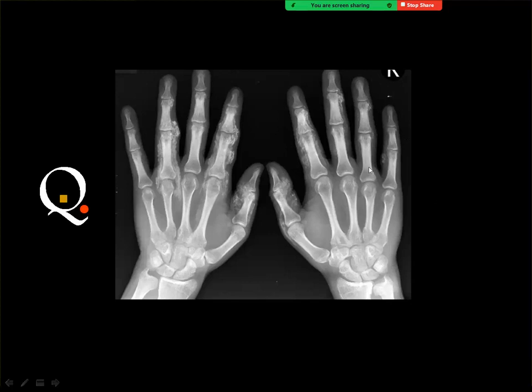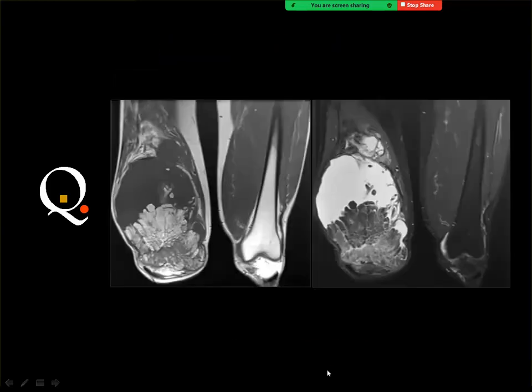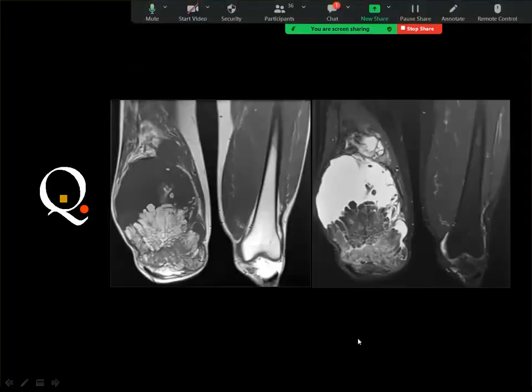But this is not scleroderma because one of the essential findings of scleroderma is resorption of the terminal phalanges and contraction deformities of the joint. This is dermatomyositis. Next case is an MRI of the knee joints, and there is a problem on the right one.